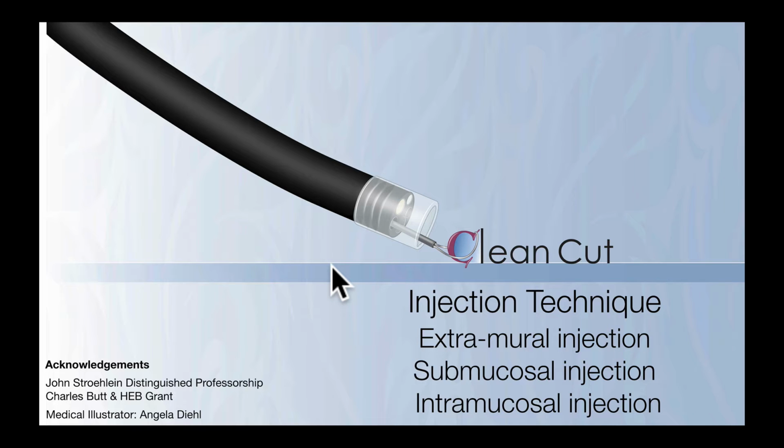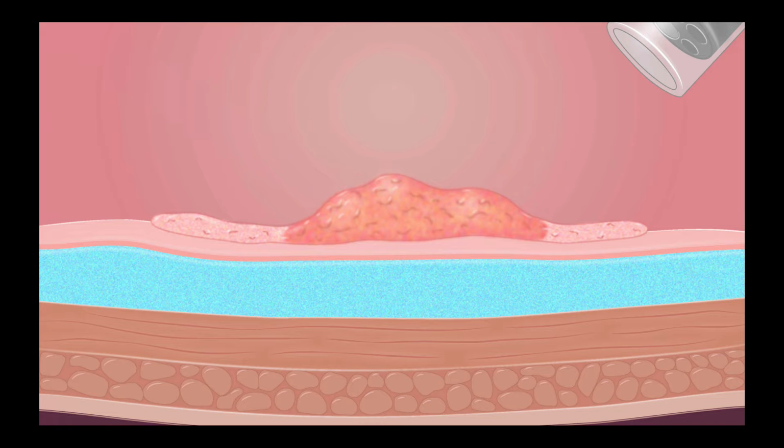Tips on successful submucosal injection and how you could avoid or deal with either extramural or intramucosal injection. Extramural injection. How does this happen?